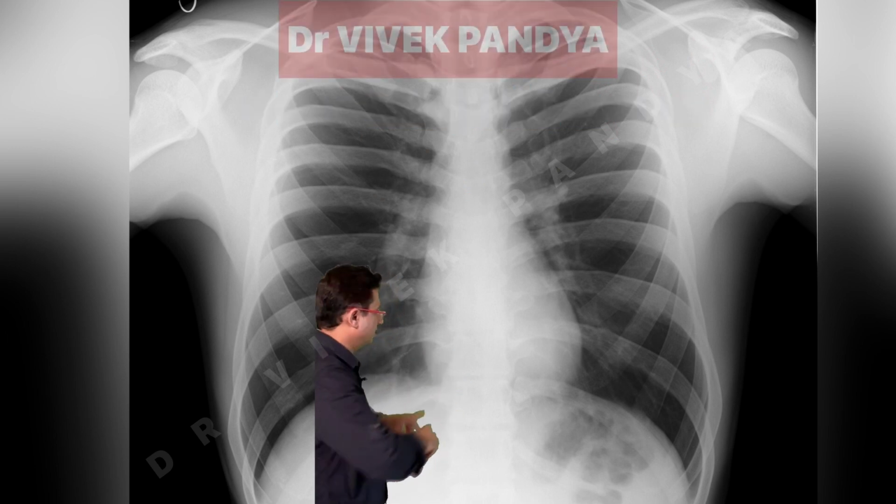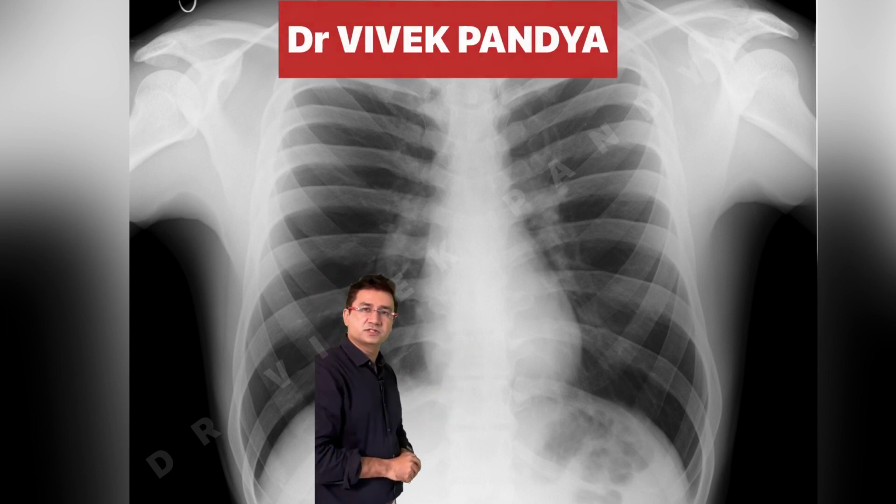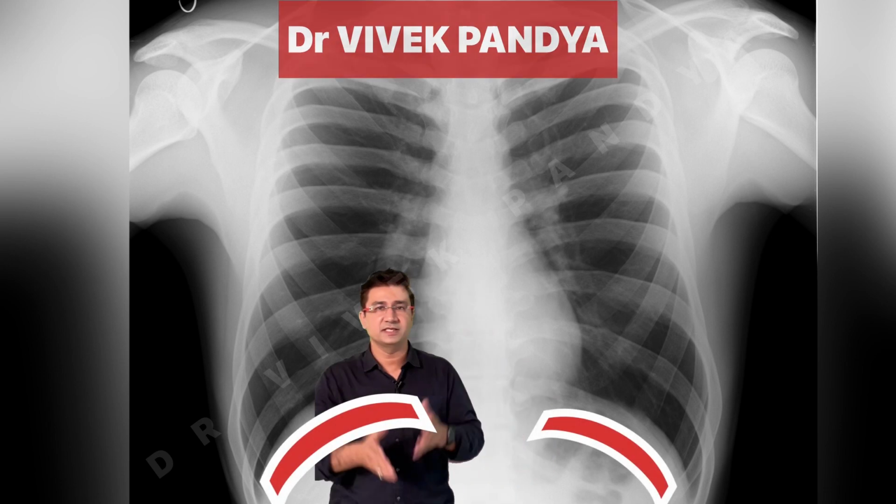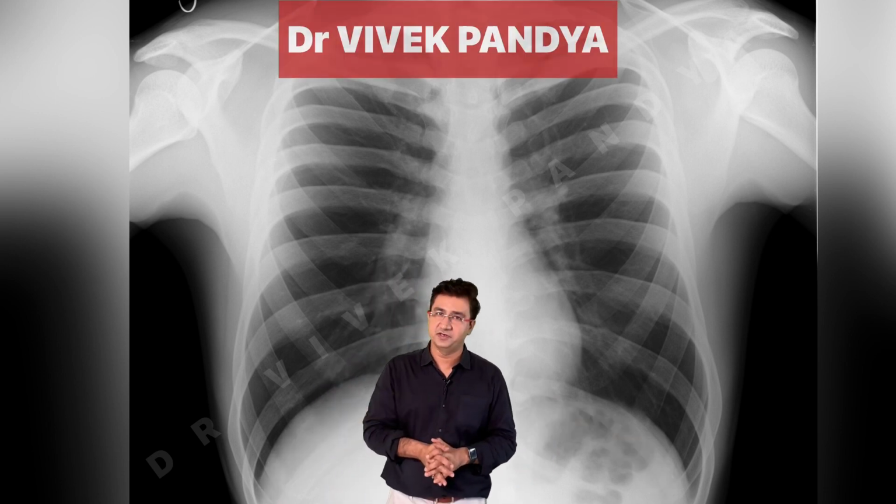Then the inverted C-shaped curves on the two sides are the diaphragm. The diaphragm is the muscle that separates the thorax from the abdominal cavity.